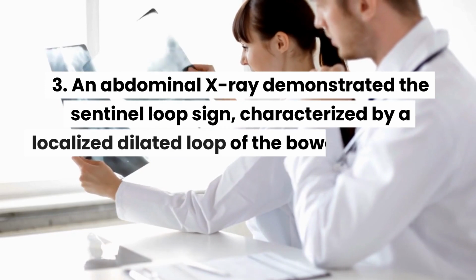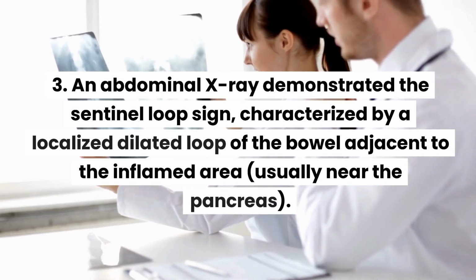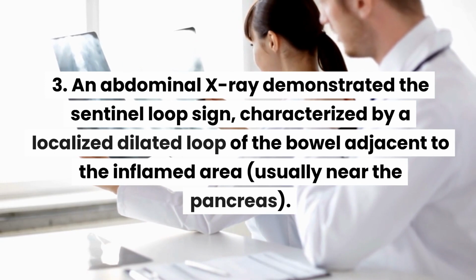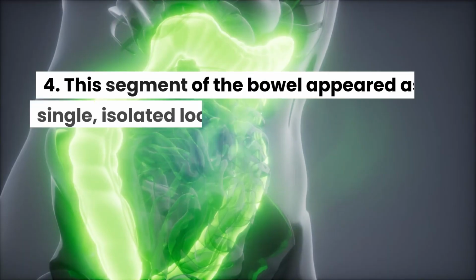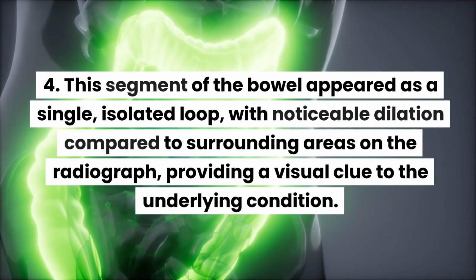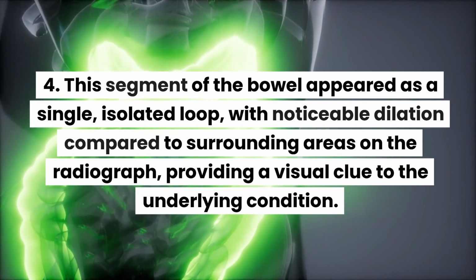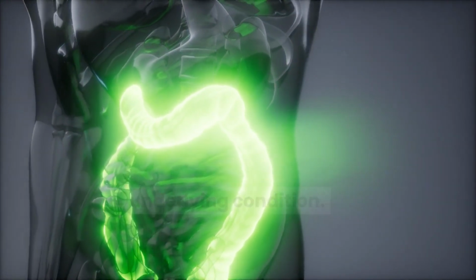3. An abdominal X-ray demonstrated the Sentinel Loop Sign, characterized by a localized dilated loop of the bowel adjacent to the inflamed area, usually near the pancreas. 4. This segment of the bowel appeared as a single, isolated loop, with noticeable dilation compared to surrounding areas on the radiograph, providing a visual clue to the underlying condition.